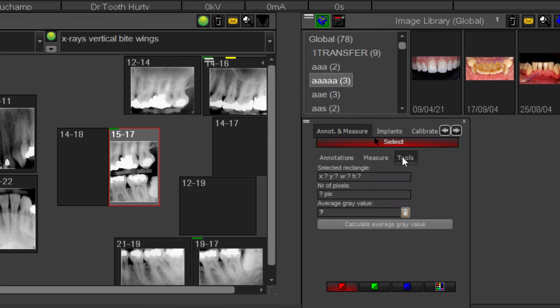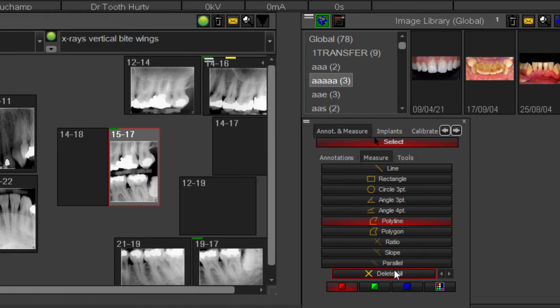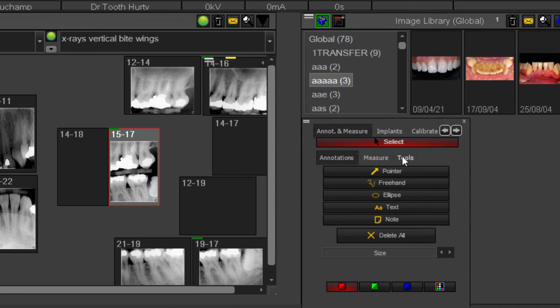The Tools tab is again something that comes with lead tools, and I've never used this tab. It's another moot tab that is not necessary in the software. Once you're finished with the measurements, if you wanted to remove them, you could delete them all or leave them there, up to you. Okay? For demonstration purposes, I will delete it. We will go to the implant now.